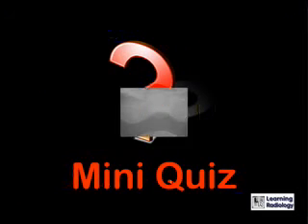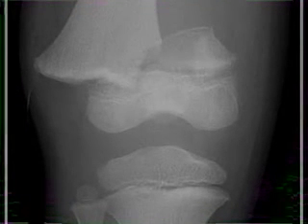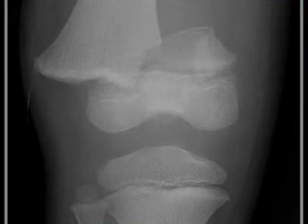Here's a mini quiz for you. Take a look at this knee injury and decide which type of Salter-Harris fracture it is. You can pause your MP3 player or computer.